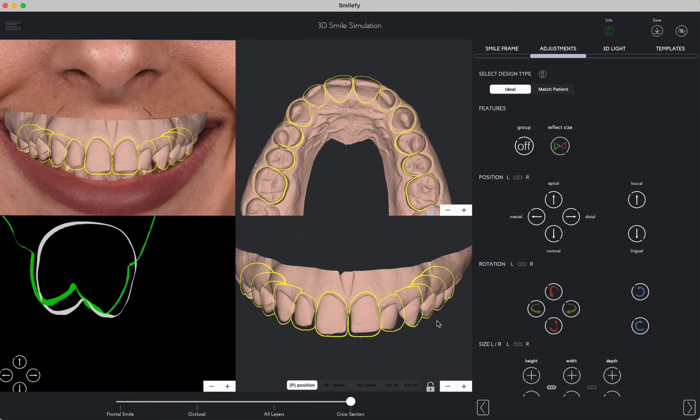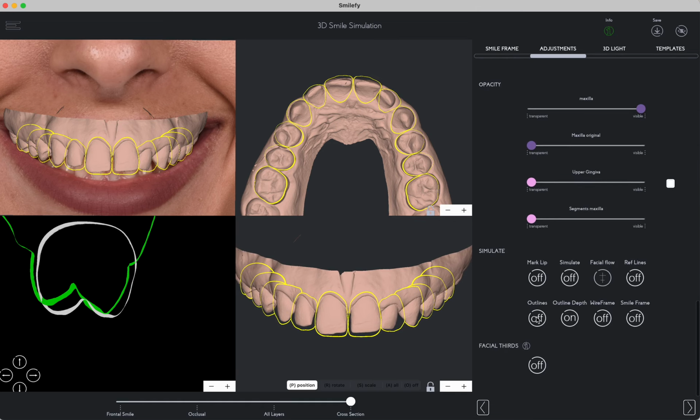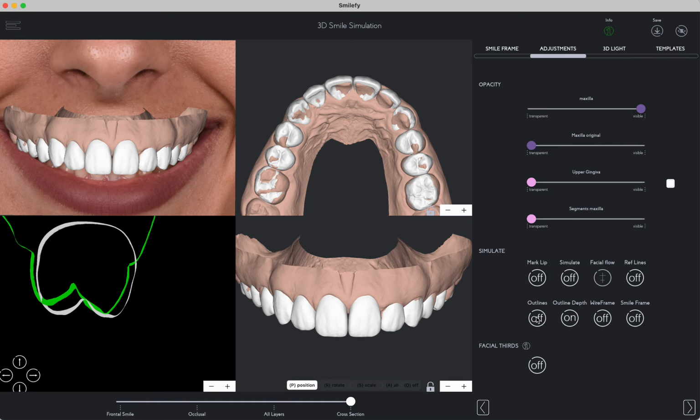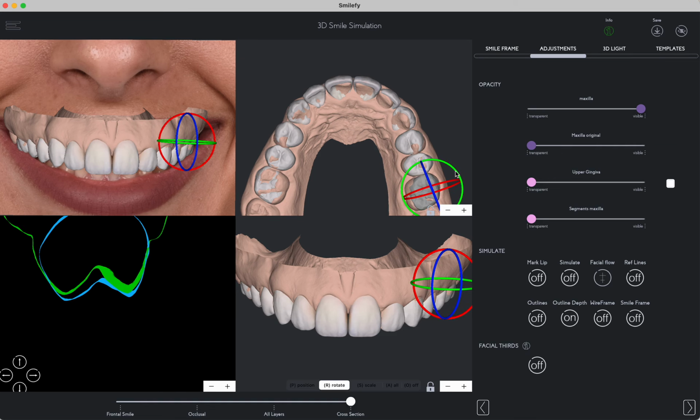This view, this outline view, 3D outlines view is very, very helpful, and it helps me speeding up the process of design. And here we see we have the rotation a little bit. And here we go. That's good.